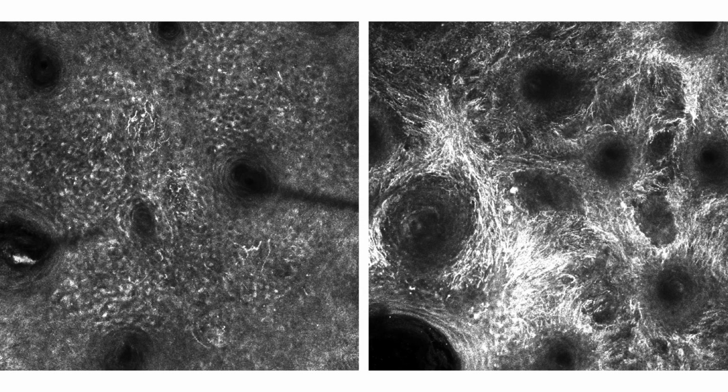But mostly on the right side, we can observe the presence of single as well as confluent dendritic cells tending to form this junctional nesting. And junctional nests in an acquired pigmented flat lesion of the face are related to the presence of a melanocytic lesion, a malignant melanocytic lesion, since this is a lentigo maligna, which was confirmed, of course, with histopathology.